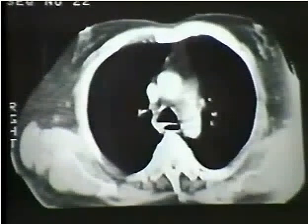How did we prove that was a vascular structure? We went and took the patient back to fluoroscopy, put him back in the upright position where we had seen it on the routine chest film, and then had him breathe deeply in and out. This structure changed size, confirming the correlation between the CT scan and the chest film. This was, in fact, a vein.